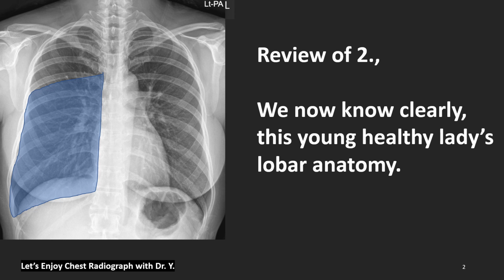Let's review session number 2. We now know clearly this young healthy lady's lobe anatomy, right? What is the lobe of this blue color zone? Yes, correct. It is the right lower lobe.